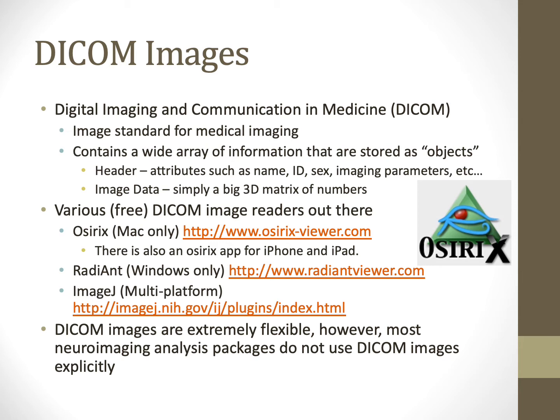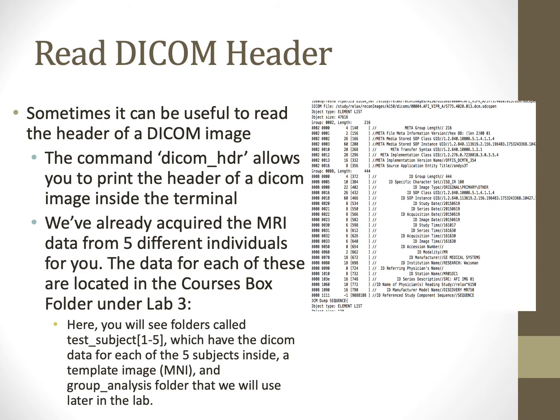DICOM images are extremely flexible. However, the majority of neuroimaging analysis packages do not directly use DICOM images when analyzing data. However, sometimes it can be useful to read the header of a DICOM image. The command DICOM_HDR allows you to print the header of a DICOM image inside the terminal.